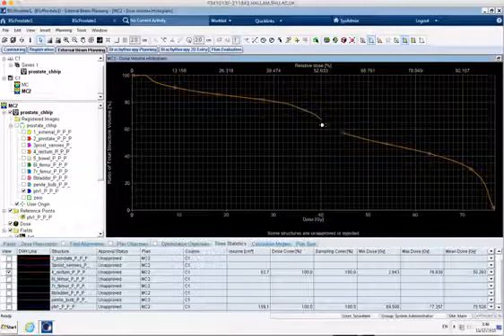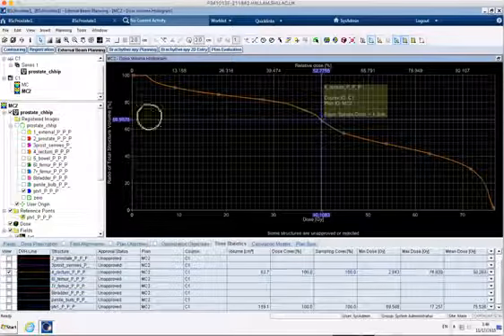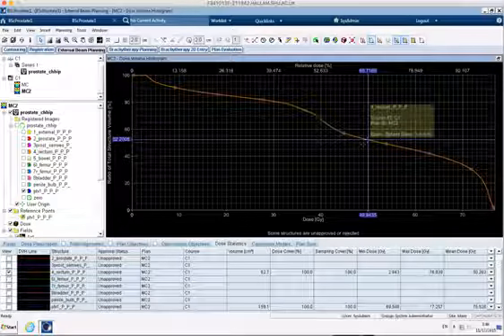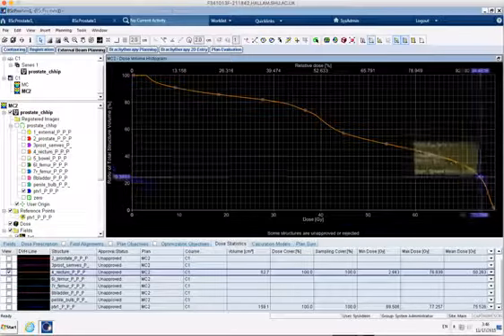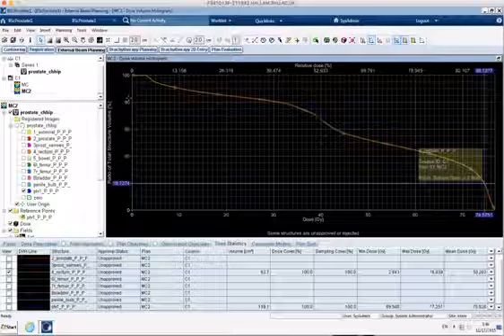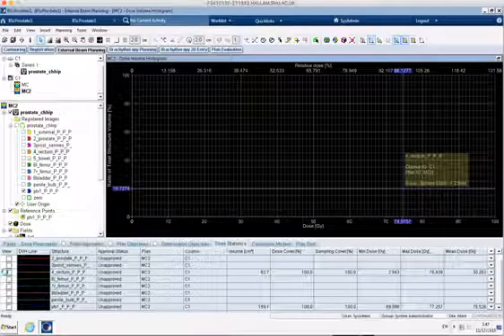So V40 here on my crosshair, and it wants to be less than 70%, and you can see that it's just about less than 70%. V50 less than 60, I can see that it is. I'm going to skip a few, and V74 less than 3%. So V74 is over here, and you can see we're well over that one. So again, we could maybe look to optimize that, check that our coverage is nice and tight in the posterior border, but actually we might not be able to achieve that using 3D conformal planning, which is part of the reason for doing it as we are with this patient.